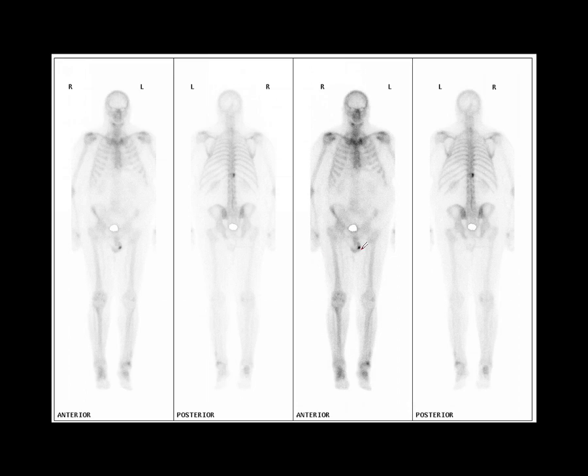Notice some urinary activity here. This is the kind of contamination that we spoke about, that we mustn't mix up with metastases. We spoke about it in a previous talk. There's a photopenic defect here, which might be a hernia, perhaps. But in any case, the patient came with a bone metastasis, and because they were in a trial, we had quite a few scans to look at.